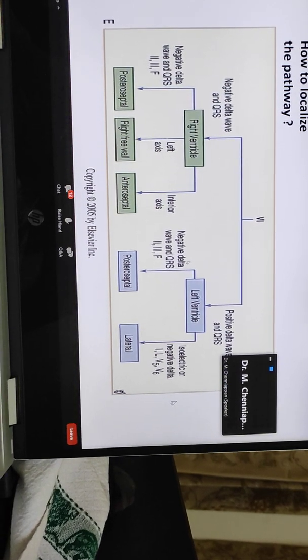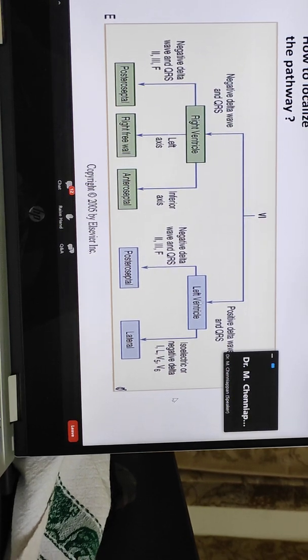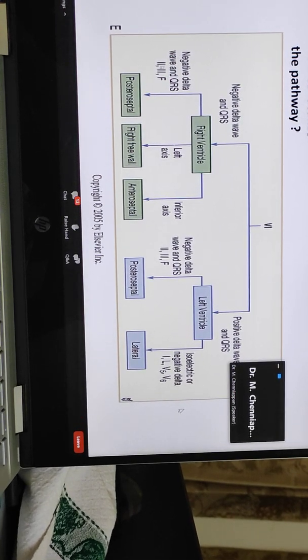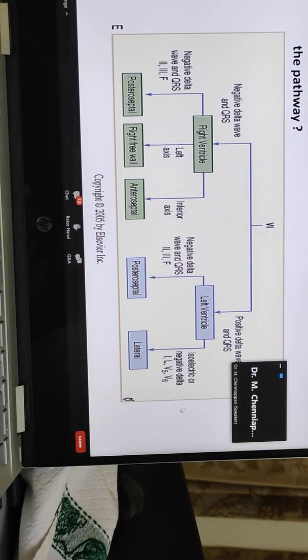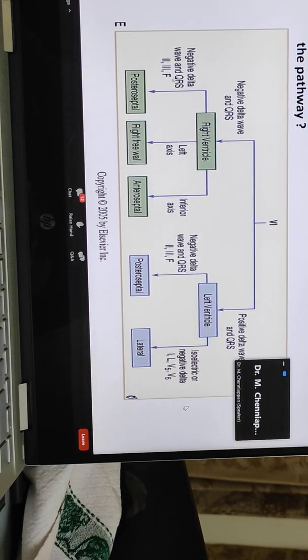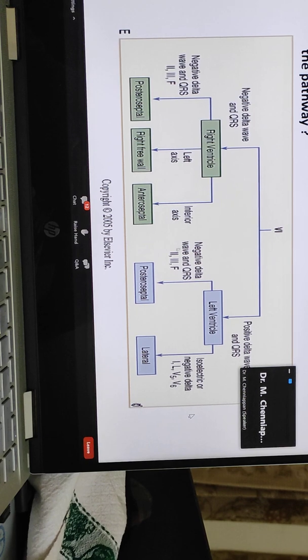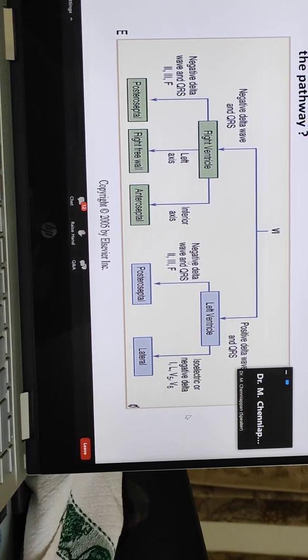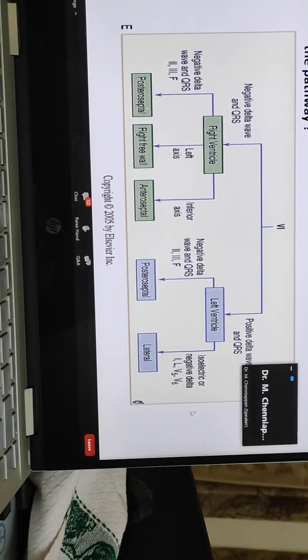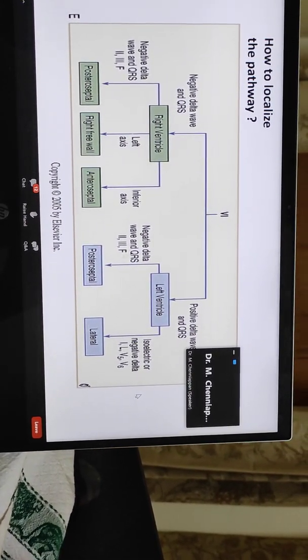Having seen that, next you have to concentrate on the inferior leads. Come to the limb leads. Either with a left-sided or right-sided pathway, if your inferior leads are showing a negative delta wave, I can say your inferior leads are mimicking old inferior wall myocardial infarction. Many times this is mistaken for inferior wall myocardial infarction. Having assessed right side or left side, look at the inferior leads. If they mimic inferior wall myocardial infarction because of the negative delta wave, you are dealing with a posteroseptal pathway. This is the most common type.